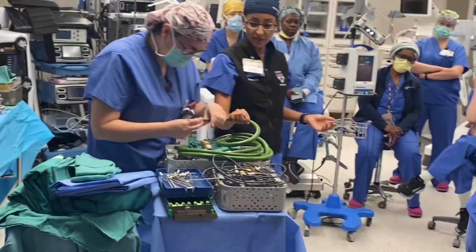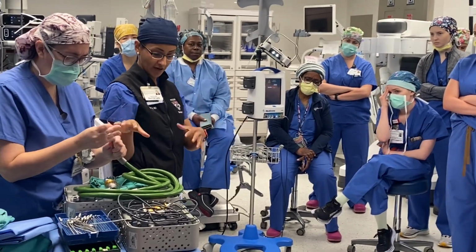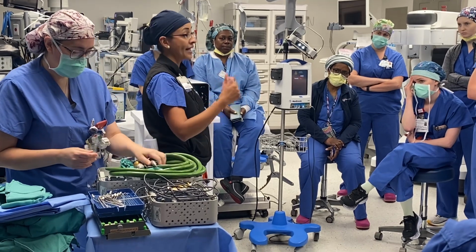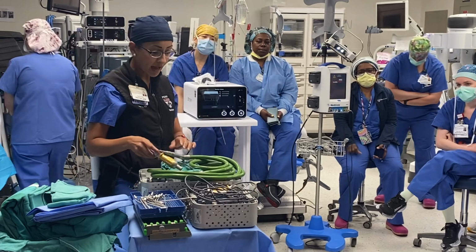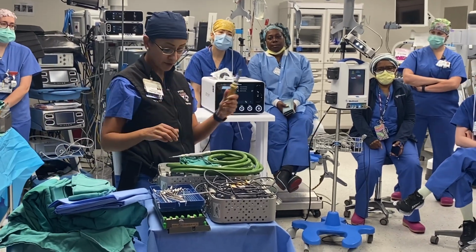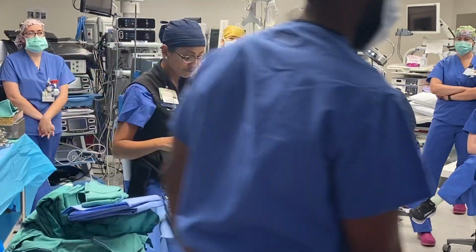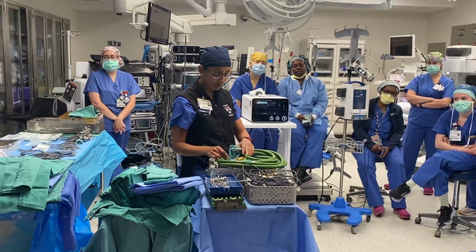You guys are probably used to this a little bit more, but it's all kind of the same. This is the workhorse drill that we use, as you guys know, both in the head as well as the spine for the most part. So the most common things that we're going to use are that perforator, the B1 with the foot plate, B1 without the foot plate. Occasionally we will ask for the M8 or AM8.